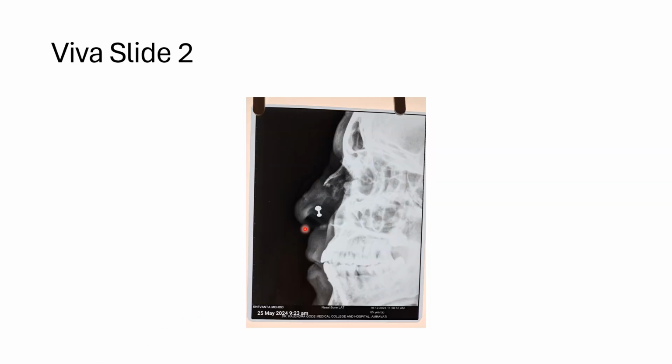In this lateral view of the face, you see this soft tissue. Gray means soft tissue. Now what is this here? This is some ornament of this lady. First of all, while coming for an X-ray, ornaments should be removed. But this patient did not comply with the instructions. So you can see the nose pin, the ornament they use on the nose.